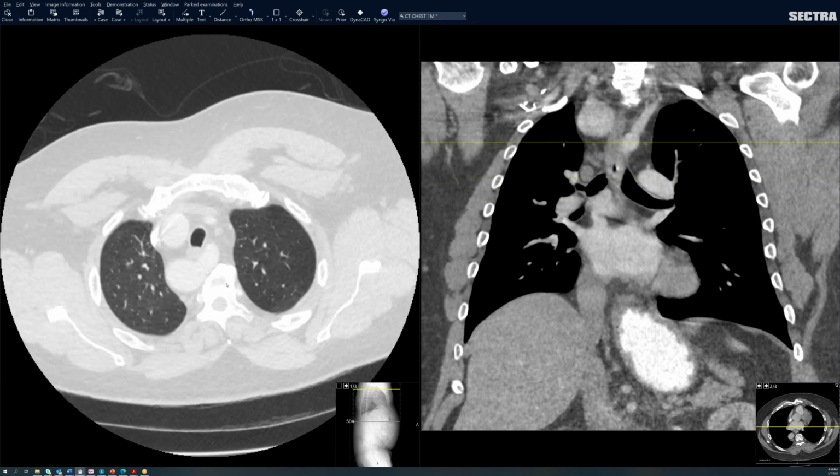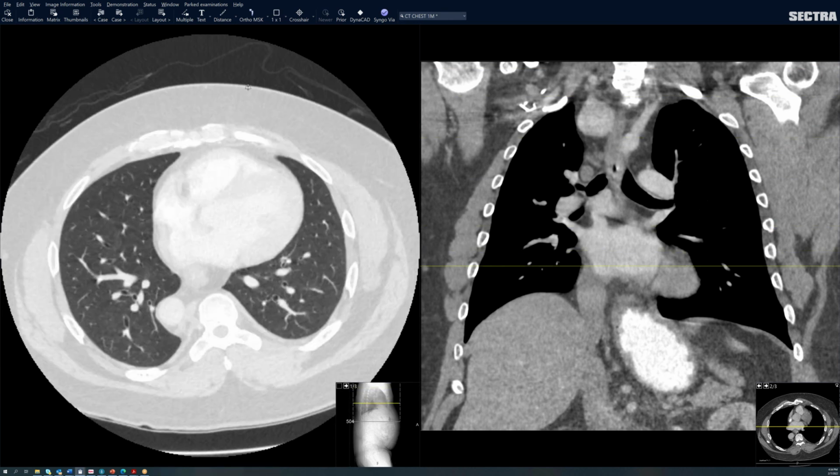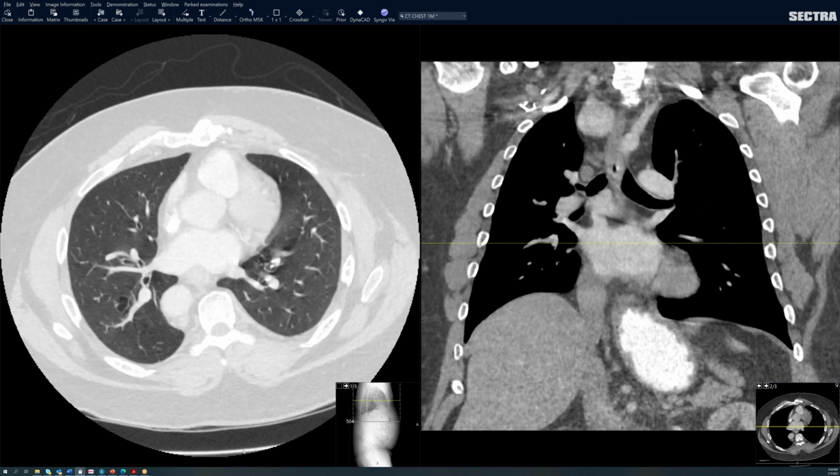I think it is some kind of destroyed lung parenchyma, and that's why I was thinking, is it like an old bronchopulmonary dysplasia? And we were trying to get a history of whether this patient was prematurely born or something. So it is some kind of an early insult to the lungs, I think. Something that happened very early in life, and that's why there's a bunch of these cardiovascular abnormalities and these very interesting looking lungs. But this was more like something to show the group and see what people thought about it. It's not like I have an answer to this case.